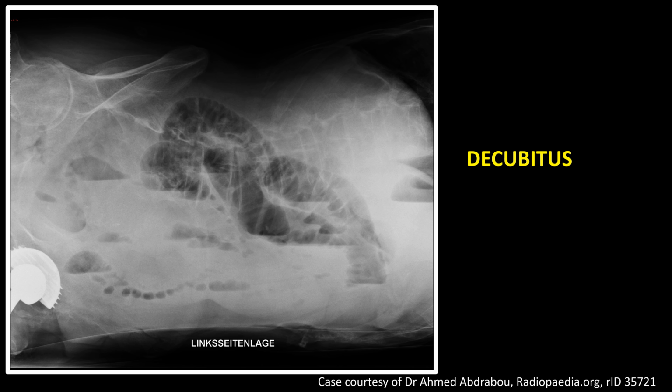Sometimes, when erect posture is not feasible or does not give a proper diagnosis, the lateral decubitus position is given to the patient for the X-ray, as you can see in this image. In the lateral decubitus position, here we can see the air under the abdominal wall, and this is the air in the large intestine. So we can see the air under the abdominal wall if the lateral decubitus position is given for the investigation of air in the peritoneal cavity.